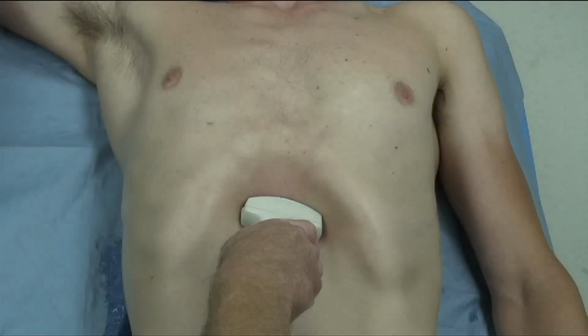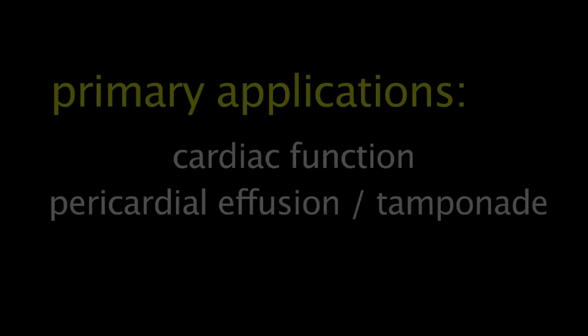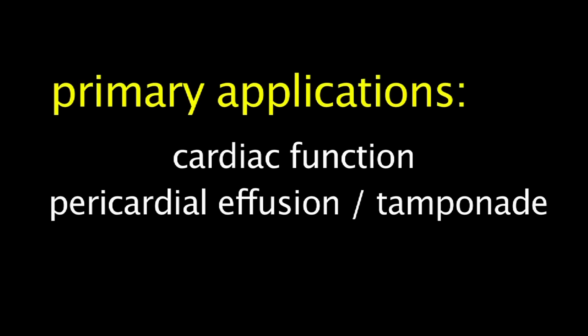Cardiac ultrasound is also a component of the FAST exam in the setting of known trauma. Only the primary applications of cardiac ultrasound will be covered in this video. For advanced techniques and applications, please view extended applications of emergency echocardiography.